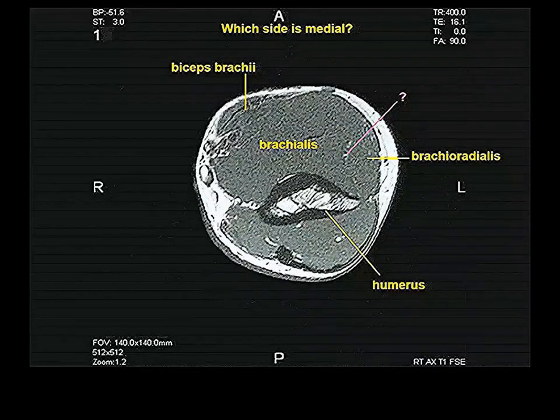This is something on the lateral side, between brachialis and brachioradialis. Right, very good. Somewhere here's the radial nerve, probably that dot there, but also there's an artery that goes with it called the radial collateral artery. I can't tell you for sure which is which here, but that's what sits in this interval: radial nerve and the radial collateral artery.